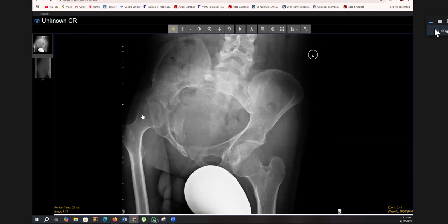By looking at the shape of the pelvis, I think it's a female patient, because of some gynecoid features. What's the opposite of female? Male. Where would you put the gonad shield on a male patient? So this is a male patient. Now tell me what the diagnosis is.